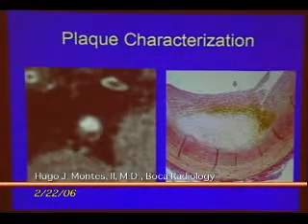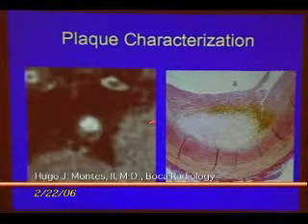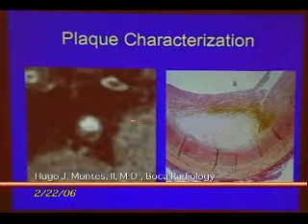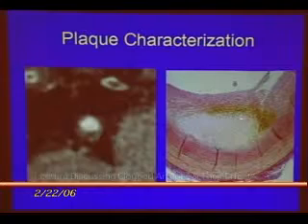Unfortunately, this patient passed away. I'm not sure if it was because of this lesion. I would think not, but we were able to obtain a histologic comparison of this lesion, and here you can see the composition of fat of that plaque.